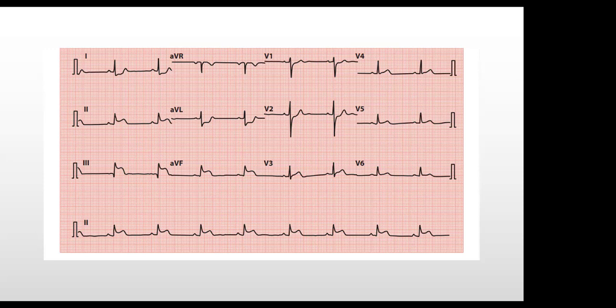Yes, I was going to say that when comparing lead 2 and lead 3, the ST segment elevation in lead 3 is more than that of lead 2, meaning that it's a right coronary issue, not circumflex. Then, to tell whether it's proximal or distal, at least there's evidence for distal, but we don't have evidence of proximal involvement until we do the right-sided leads, lead V4 right. That one will give us more information as to whether the proximal part is involved, but the evidence is for the distal part.